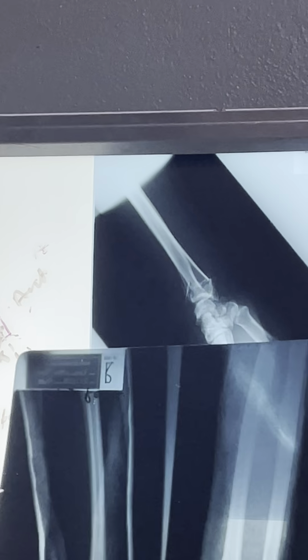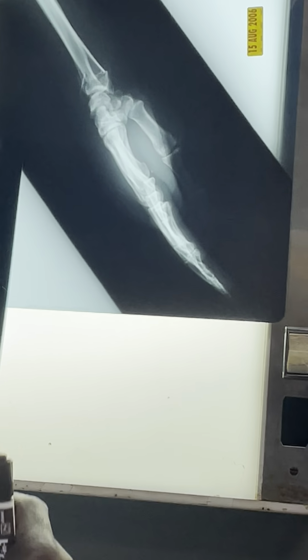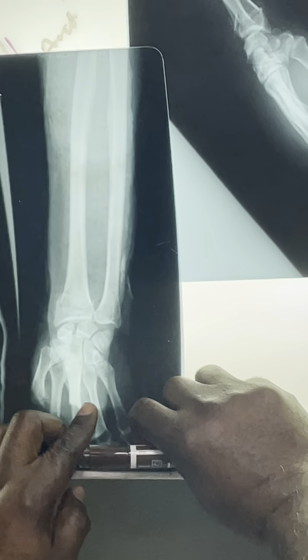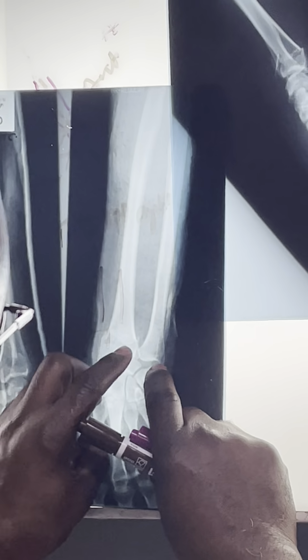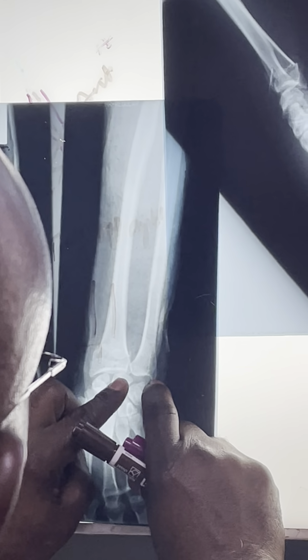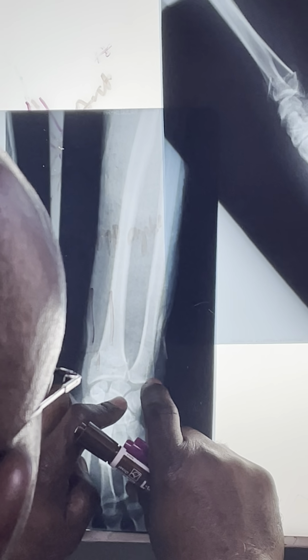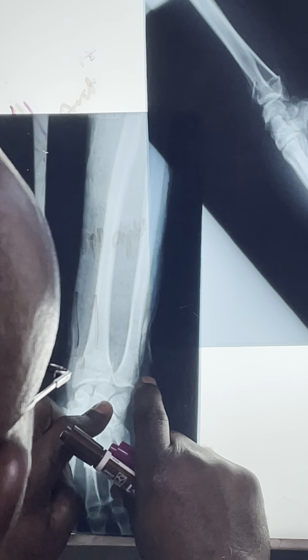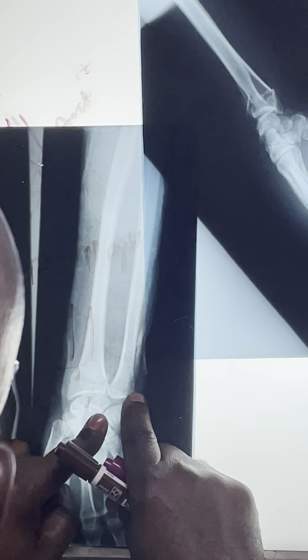Yeah, you don't see it. Look at this one here now. This is a better reduction here now, but sometimes you see the ulnar styloid comes off with the fracture. Remember I said that's one of the areas that doesn't heal normally, where you commonly get non-union. Yes. The ulnar styloid sometimes can come off as well.